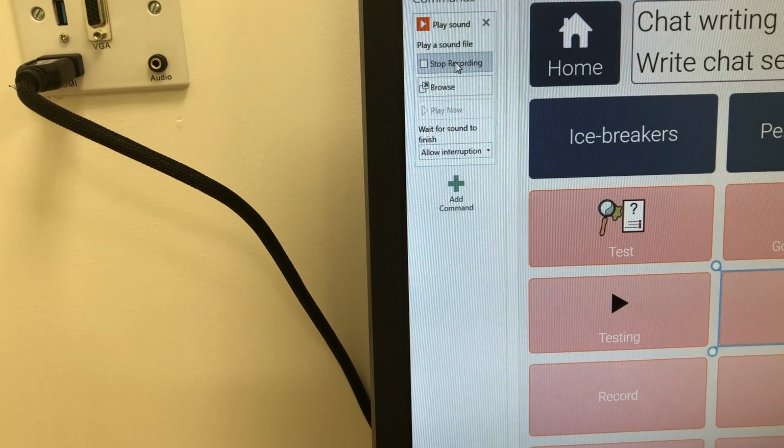Hello, how are you? I'm good today. And click stop recording when you're ready to finish. Okay, you can click play now and that will play you your message.